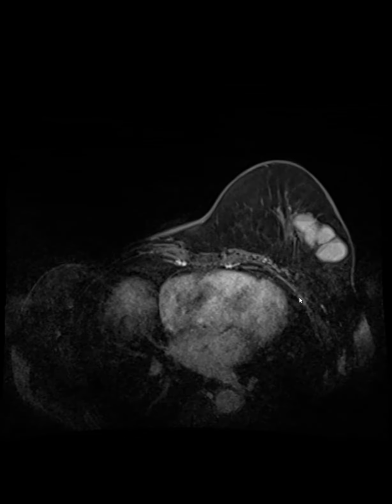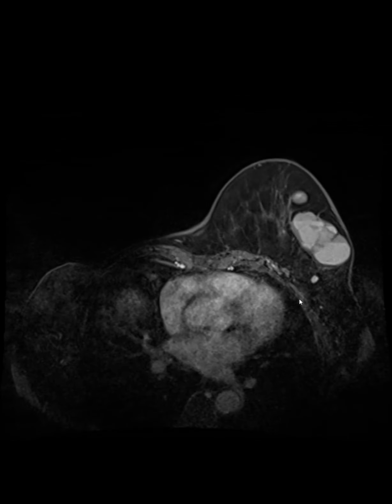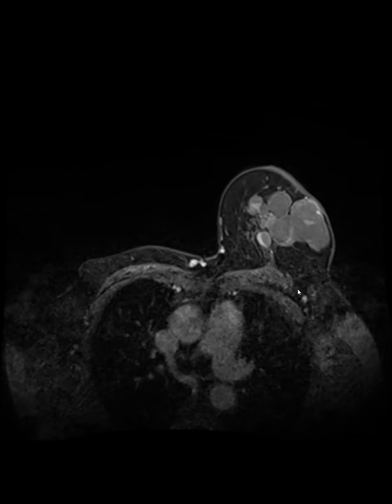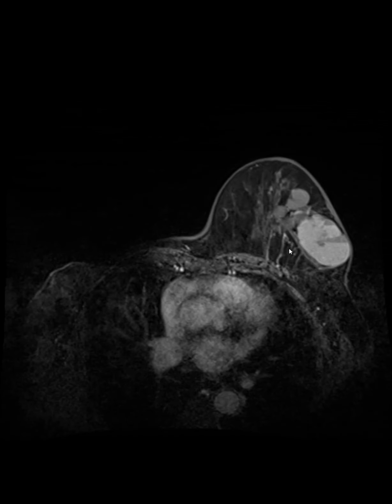So these findings should point towards the fluid level in the cystic component probably representing hemorrhage, and of course the morphological features are typical of a malignancy in the opposite breast at a later date.